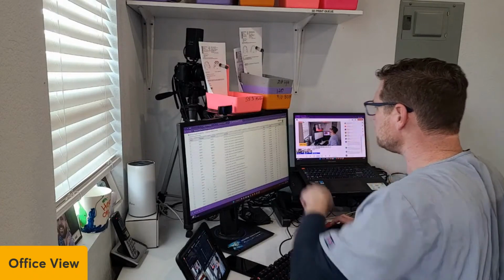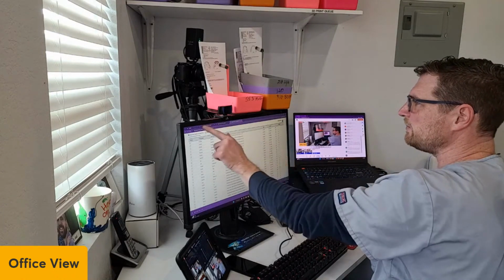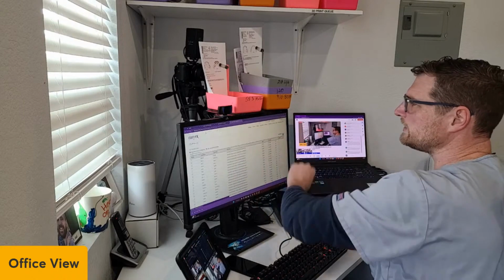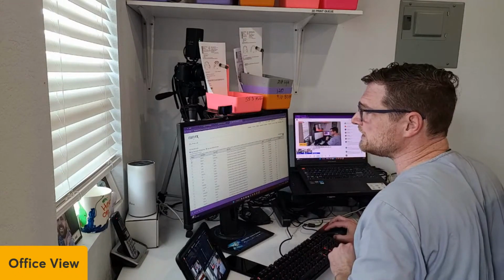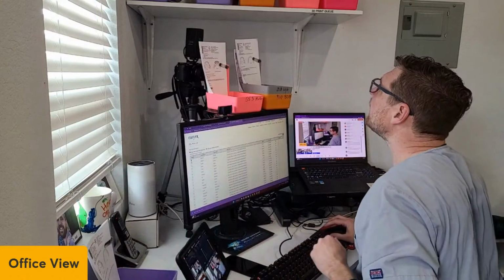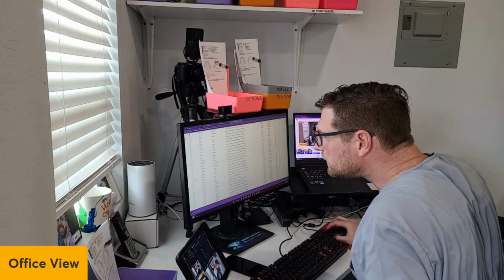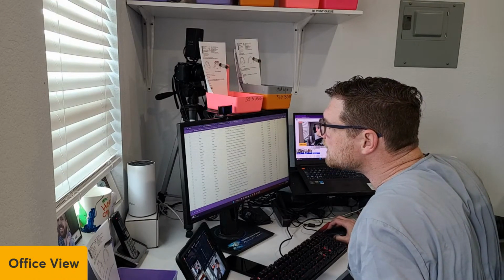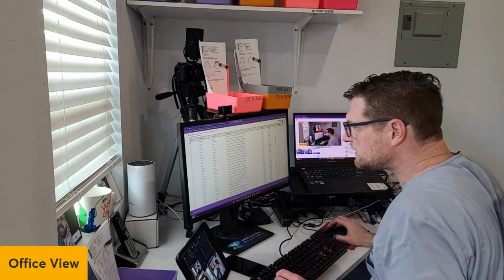So you notice all these check marks here. There's a bunch of check marks. If I click this up here, show only models not printed, it will remove all the ones that I've already sent to the printer. So it makes your list shorter and it's easier to use. So I know I have Addison here. I have Josh. This does go quicker when I can say the name out loud better. I'm going to do it real quick.